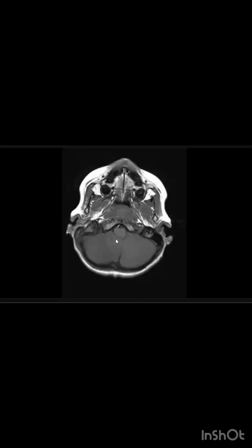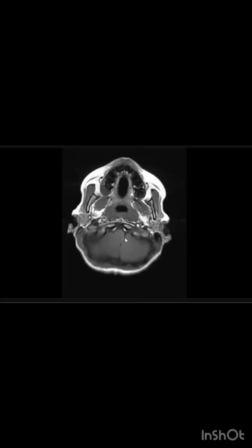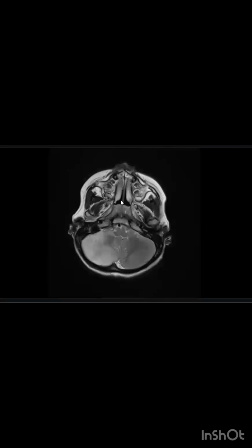I am also looking at the basilar artery, but for this I need the T2 weighted sequences, and further MRV and MRA would also be helpful.